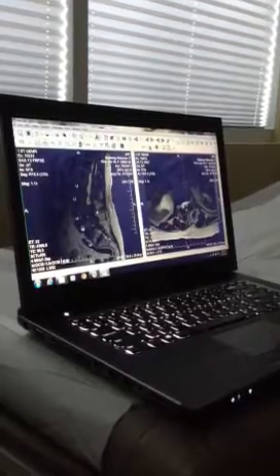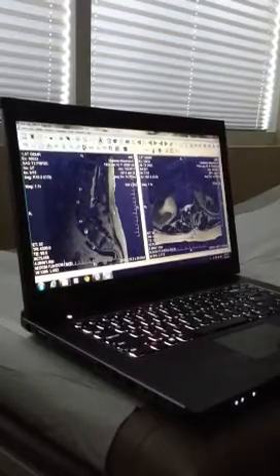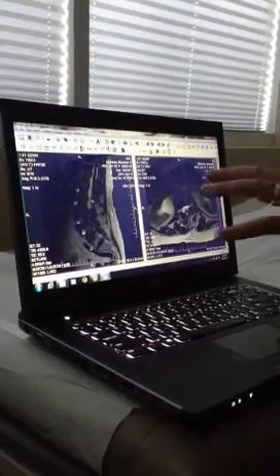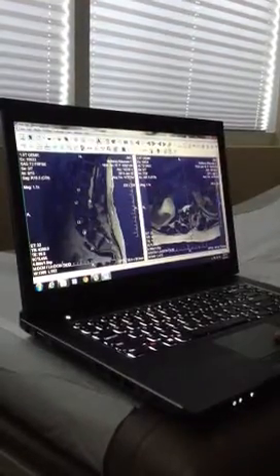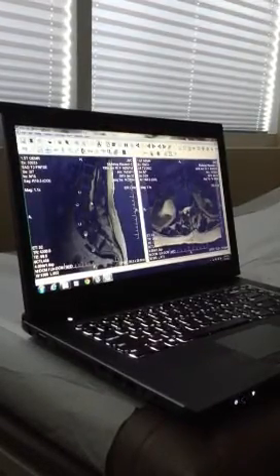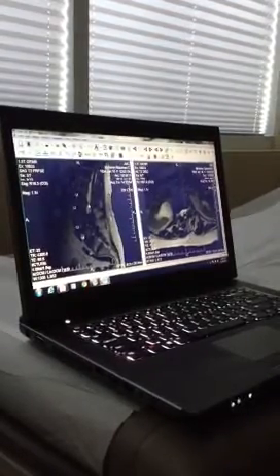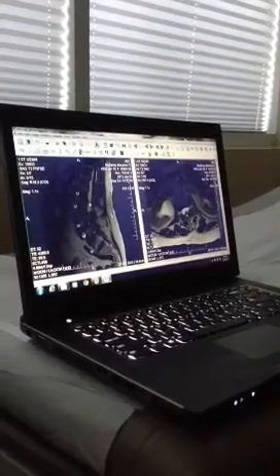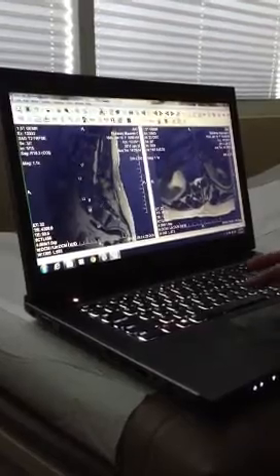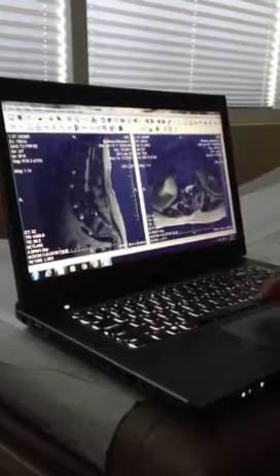So, when we look at the spine from the side view here, we see that your spinal cord stops right here at L1-2. Okay? This is where it stops. Meaning, after this termination of the spinal cord, which is normal to stop at this area, we have what's called the cauda equina, which in Latin means horse's tail, which are all the nerves that then go down into the legs, okay, and form the femoral nerve, the sciatic nerve, and a number of other peripheral nerves. But the spinal cord stops here. Okay, so there's no spinal cord down here where your problem is. The problem is the impingement on the nerves from the stenosis.